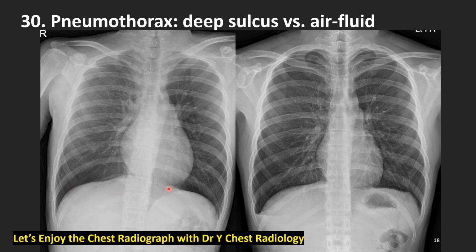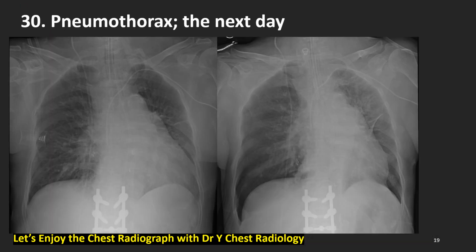Have you noticed another pneumothorax on the left side? This one, this one, this one, this one. Bilateral pneumothorax, one-day difference. ICU patient, supine AP view. Yesterday, it was okay. Today, what happened? Pneumothorax here. Not at the top, but at the lower lobe area. This is pneumothorax in AP supine view.